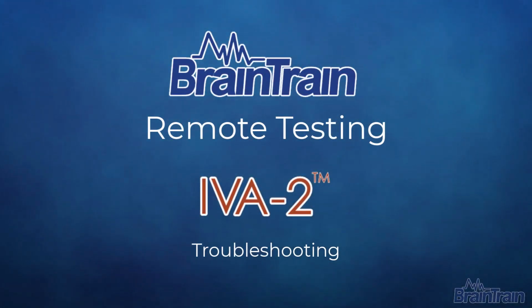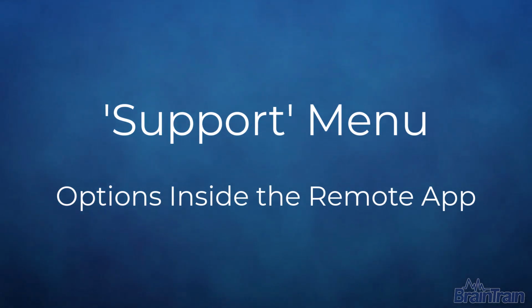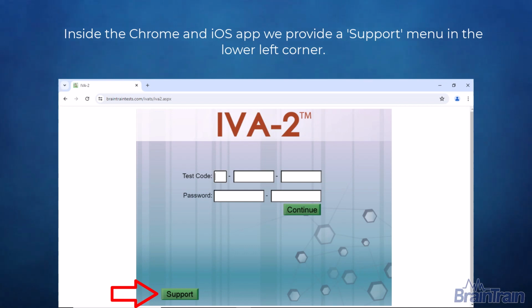Remote testing, troubleshooting. Support menu. Inside the Chrome and iOS app, we provide a support menu in the lower left corner.